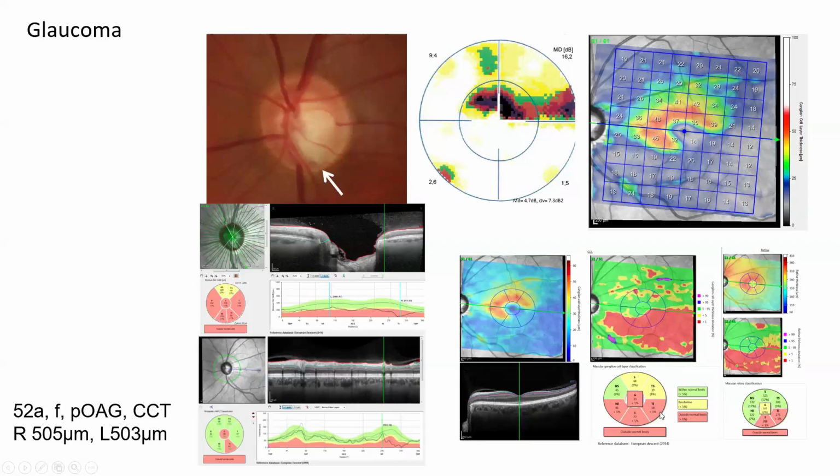In this wheel chart, we see that the ganglion cells are thinned in the area beyond the 99% percentile. So this is very exact information we don't get by ophthalmoscopy, and then it's easy to correlate the visual field of our patient who has a defect in the upper hemifield, very close to the center, nicely correlating to the ganglion cell loss in the inferior sector.